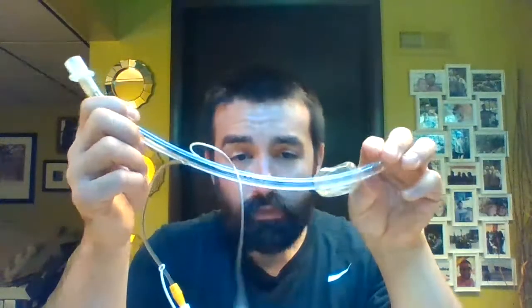We're shooting for that 2 to 4 centimeter mark above the carina. You should know what happens to that tube tip if the patient extends their neck versus flexes their neck. For a typical adult male, we're talking 21 to 23 centimeters at the teeth. Adult female, maybe 19 to 21, and that's going to depend upon their height and their anatomy.